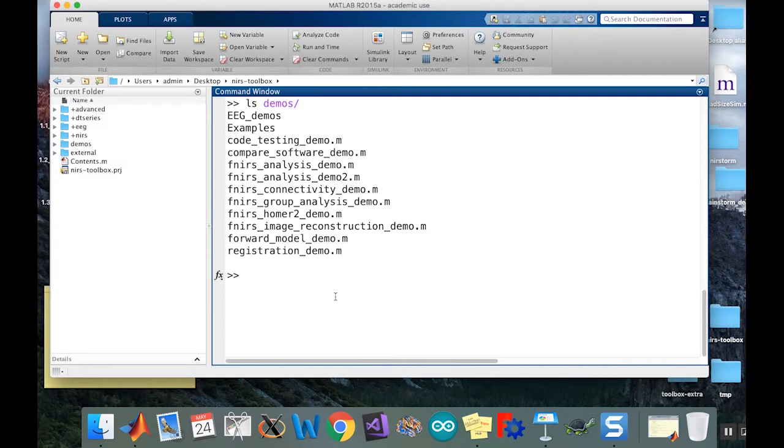As it goes through that unit testing, it then shows how to do ROC curves and stuff to look at pipelines and compare results. I'm going to skip that one for a second.